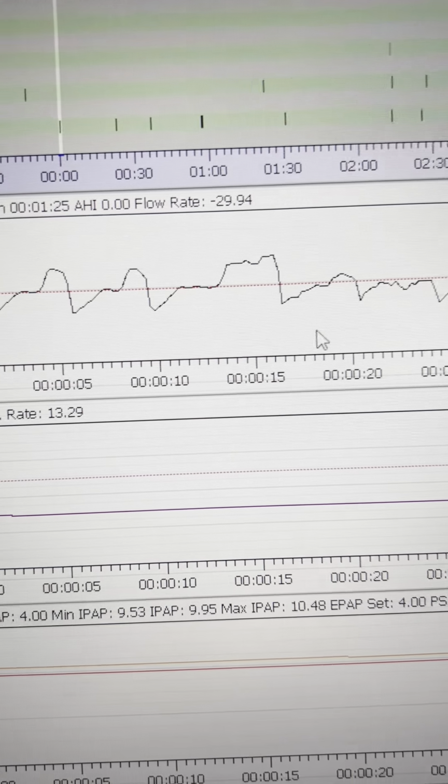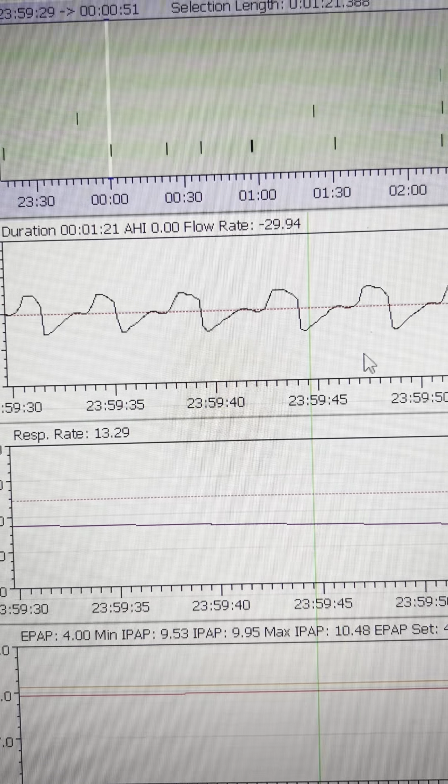See, right here, where was that? Right here you can see clear obstruction now. So it also helps you with seeing the picture more clearly. Here there's also just obstruction. You can see that it's not the same as going like wee, see? Right here it maybe is.